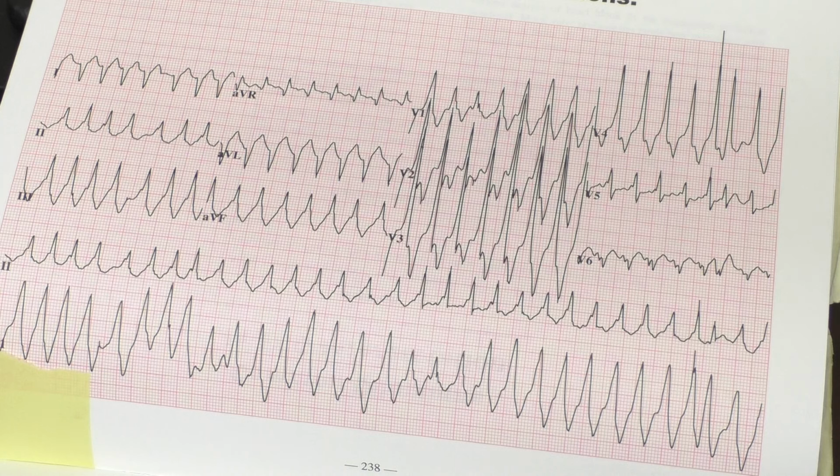Is the absence of delta waves enough to say that there isn't a Kent pathway being used in AFib? Is absence of delta waves enough to say that the AFib is not using the bundle of Kent pathway? Yeah, if they're negative, you want to pause it?